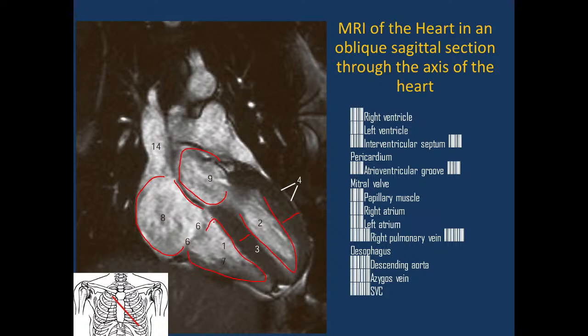And we also see the mitral valve. It is number 6. I think that is not correct. It's not mitral, it's tricuspid, because that is the right ventricle, and this is the right atrium and right ventricle. Between them is the tricuspid valve, not mitral. Very interesting picture. You can see all chambers of our organs, like the heart.